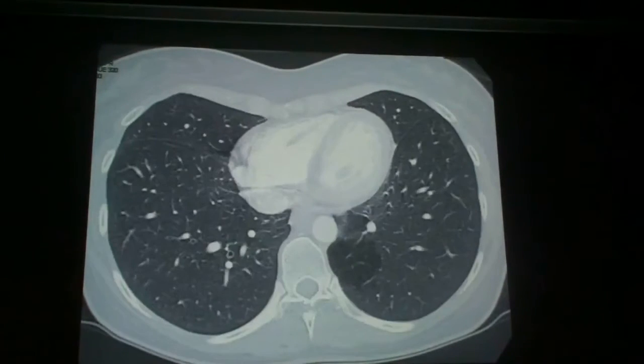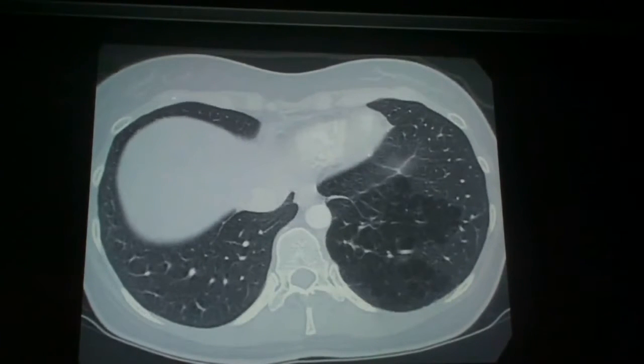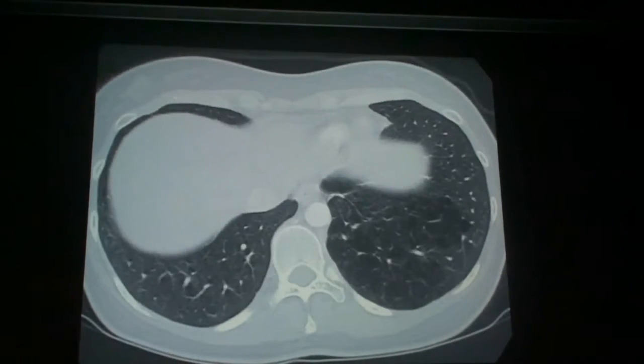In an asymptomatic young woman. Okay, again.